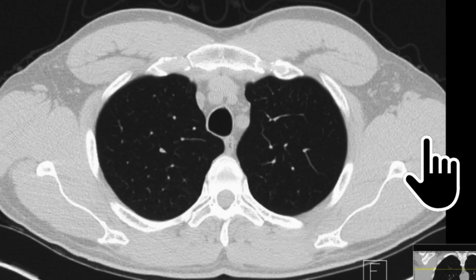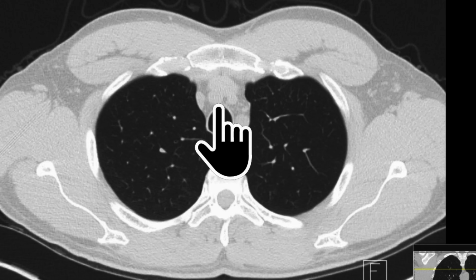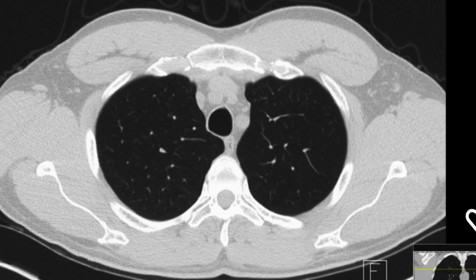we can now see 1, 2, 3 circles. Maybe that's what we're looking for. Should we follow this circle here? So is this then, because this is the right side, is this the brachiocephalic trunk, do we think? Let's follow it up.